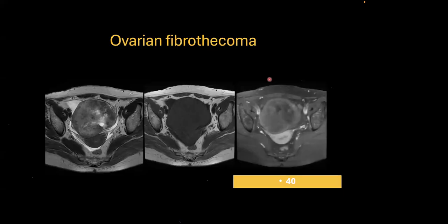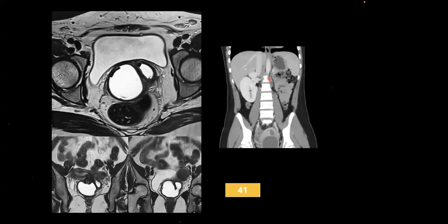It is away from the uterus. There is no point of even calling it a subserosal fibroid because it is not arising from the uterus, right? It is just abutting the uterus and it is a solid appearing adnexal lesion. And the most common differential would be ovarian fibrothecoma. And the last, most of you got it correct.